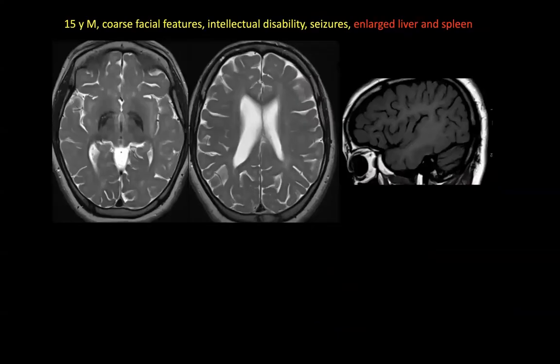Look at this case. Look at the T1 first. It's very bright, 15-year-old. This is a completely myelinated brain on T1. But look, the signal in T2 is not dark at all. It's not very, very bright like a typical leukodystrophy that I will show you later on, but this is the typical T2 appearance of a hypomyelination. Remember, discrepancy between T1 and T2.